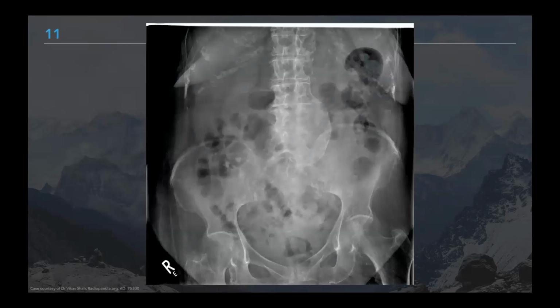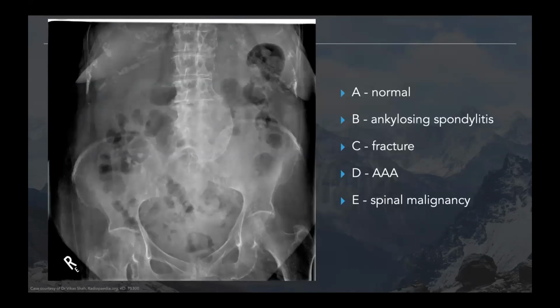Okay, getting towards the end now. Have a look at this, have a think, what would you say? What's the diagnosis? Work through your structure. Just think, if someone right in front of me now, how would I describe this? What would I say? Remember, the key is when you don't know the answer, to stick to some sort of sensible system and just describe.